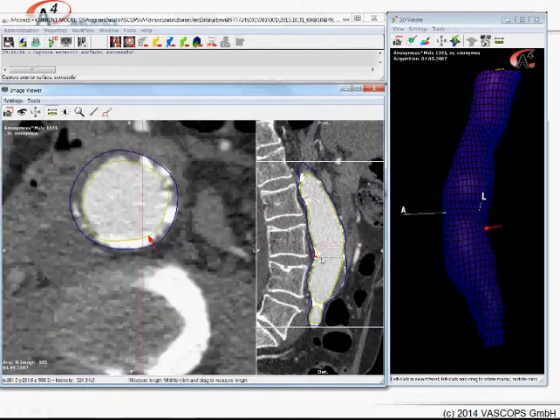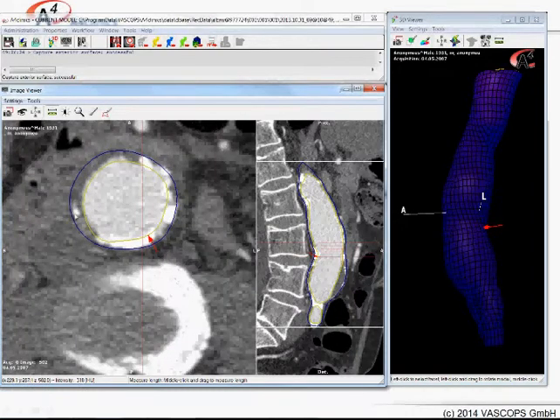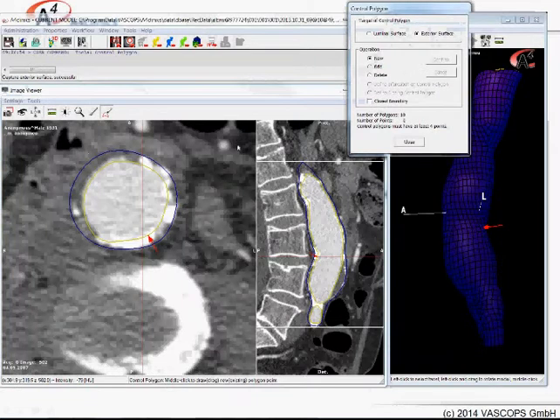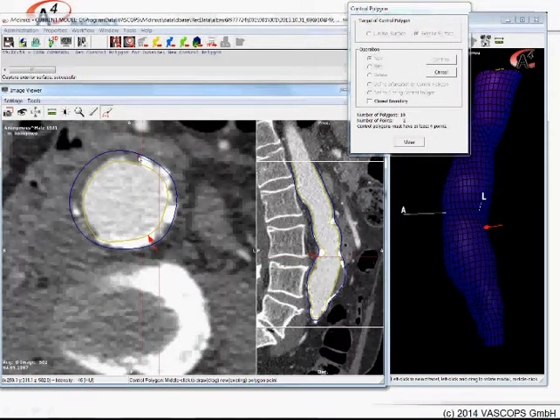Since there were already quite some control polygons there, the segmentation is already very, very nice. I will just show you how to improve it further. So let's say here the segmentation ran too much into the surrounding area. So there we just put the control polygon. So click here, and then you define manually where you, as a user, want to have the surface. So now I predefined it like this one.